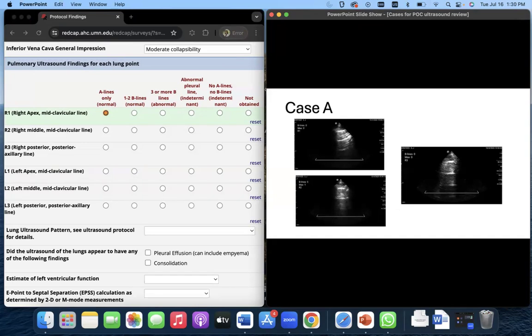also looks maybe like 1 B line. It's a little hard to see on some of these because they're so small, but looking at it, you'll see some artifacts coming from this pleural line. They have these kind of shadows, but that black shadow there is not consistent with a B line. It's a different type of pleural artifact. So in this case, even though the machine appears to be calculating a B line, it's important to verify where that line occurs, sort of at the end of the video clip. And it seems to be counting what I would say is not actually a B line.